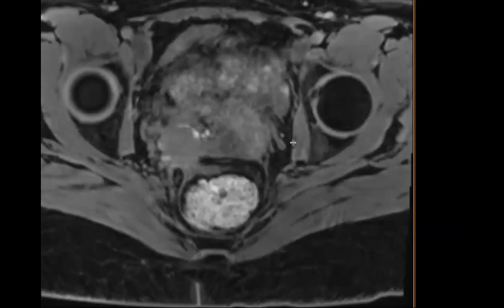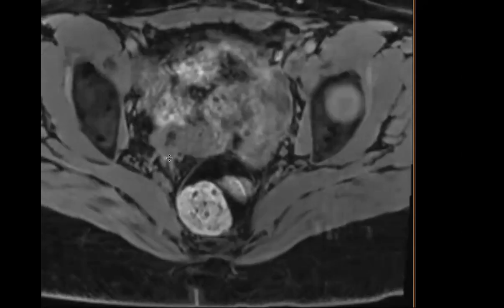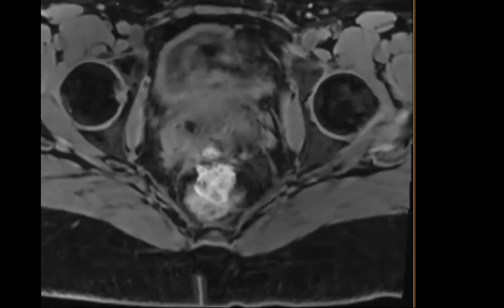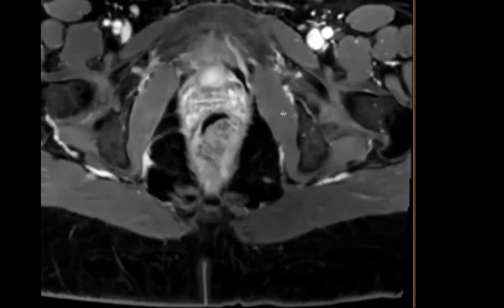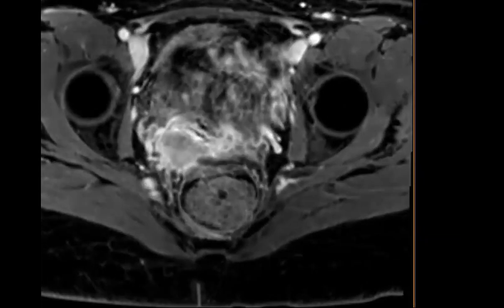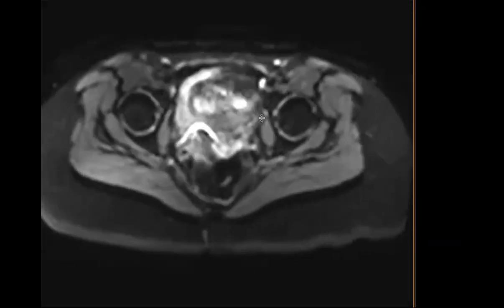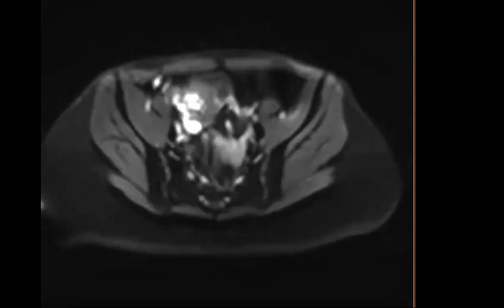Adenomyosis, I'm assuming. Endometriosis. Endometriosis, I mean, yeah. Yes, exactly. So you can see that there are some T1 bright spots here. The ureter is caught. The post-contrast really doesn't help us that much. There is enhancement, and there is restricted diffusion as well, because blood products can restrict diffusion too. So really, diffusion doesn't help us when there are endometriomas, which can show restricted diffusion.